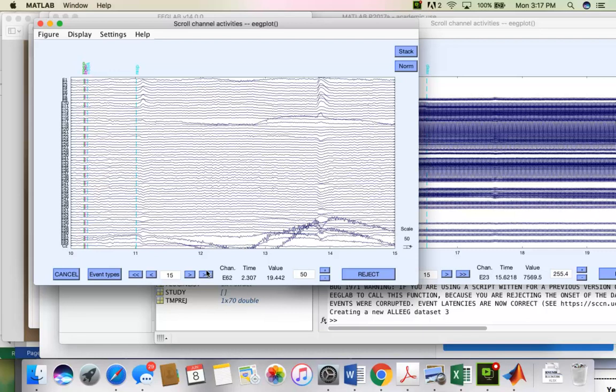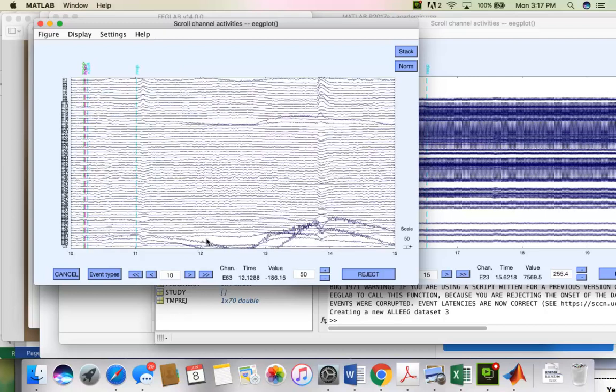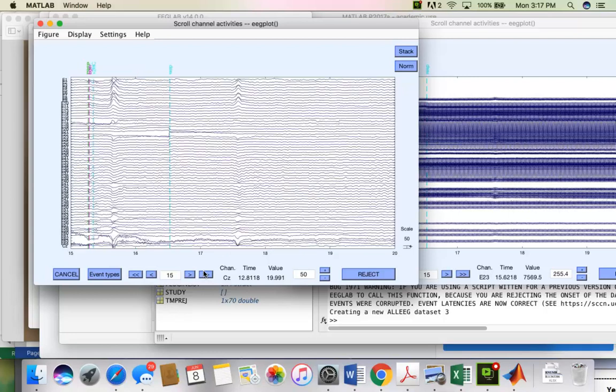There are some sections where things just go completely haywire. What you don't want to do is remove areas like this one on these bottom 5 channels where you see this kind of thing. Just leave that alone for now. We'll deal with that later. The algorithm that we run will deal with that very well.